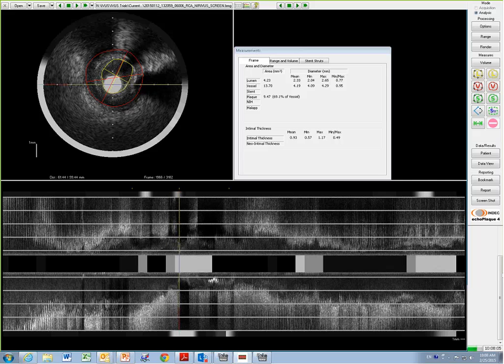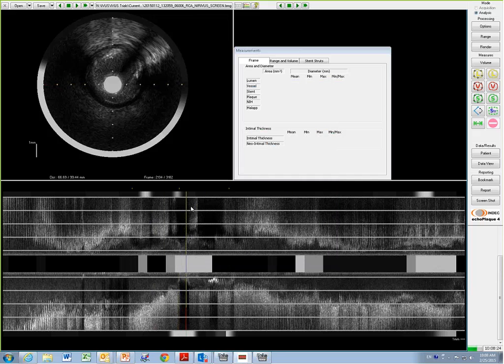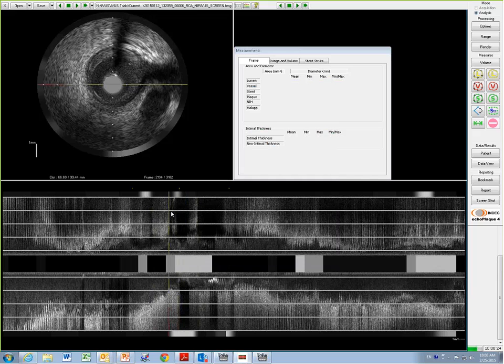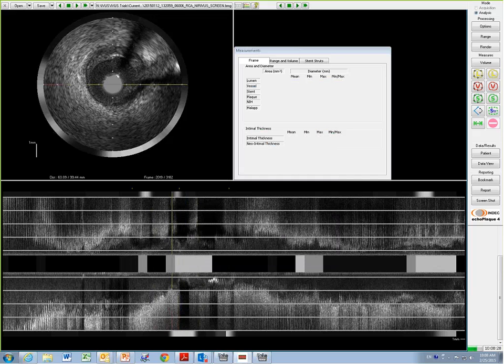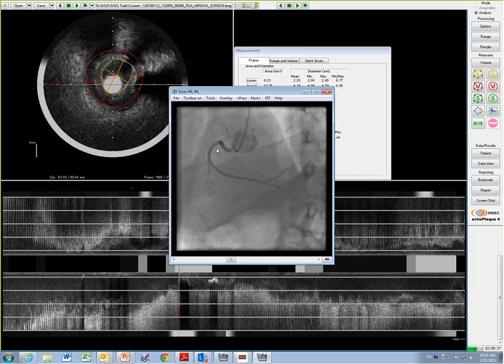In terms of this case, from the measurement standpoint, I believe this is a very tricky case, because angiographically it's not very clear where the region is, right? But if you go to the IVUS, you remember this tiny side branch. The smallest area of the lumen is just distal to the side branch, which corresponds angiographically to somewhere here. It's totally impossible to understand by angio.